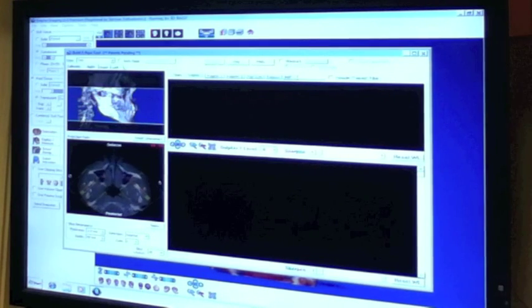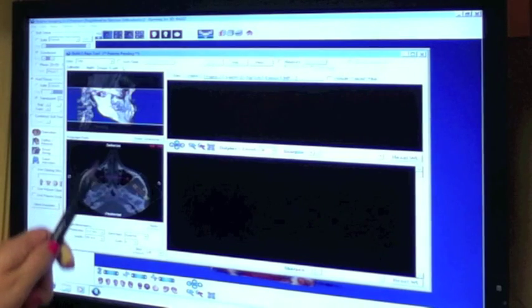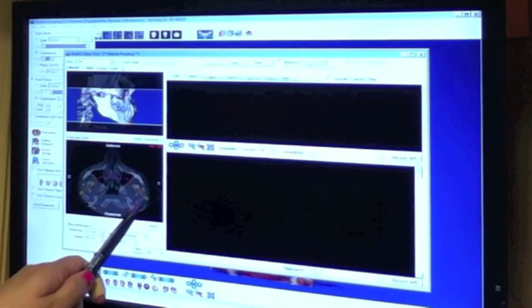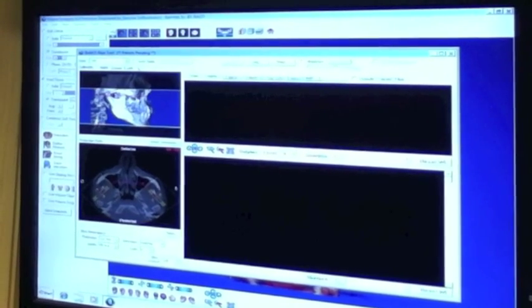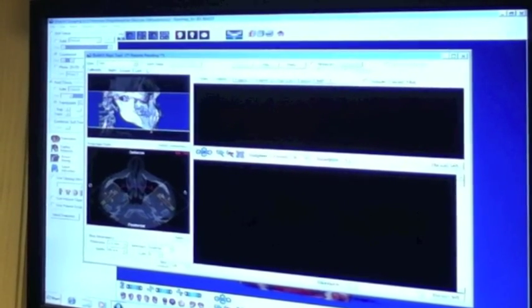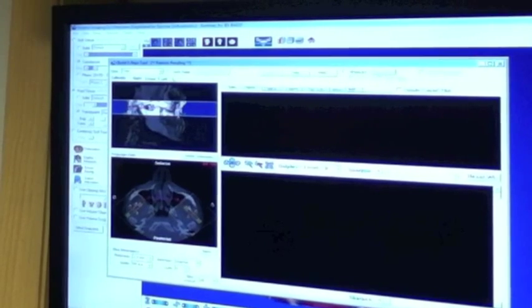The red line will bisect the condyle, and you can also look at the bottom screen, and when you see these little circles kind of shaped like kidney beans, that's when you know it's bisected. And move the bottom line up about 1/3 of the way down the jaw.